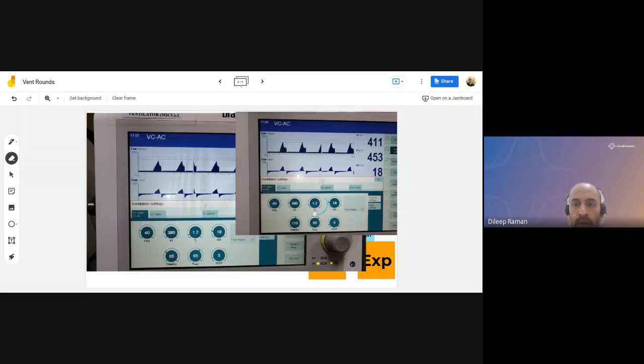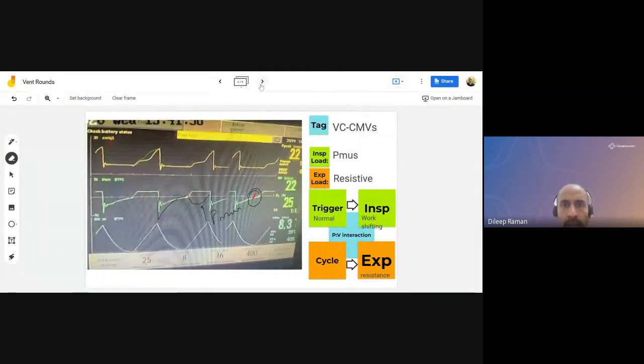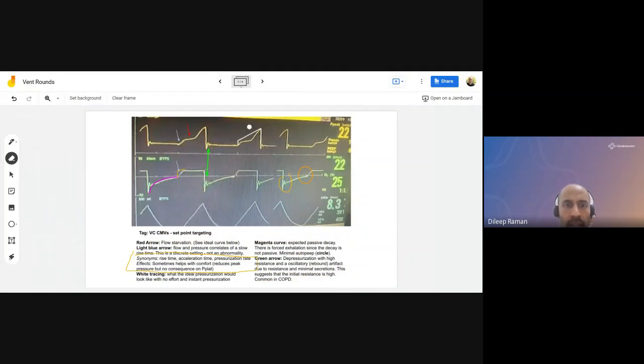But I only chose one waveform because this was relatively complex, even at the first step. These are some of the older ones we discussed. I'm sure you guys may remember. And interestingly, the rise time comment is here. Prashant, this is for you. This is what a rise time would change.